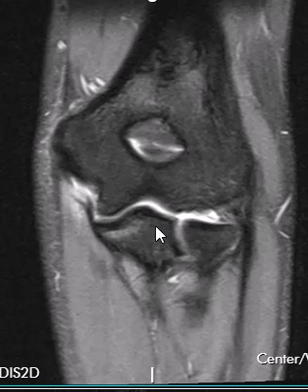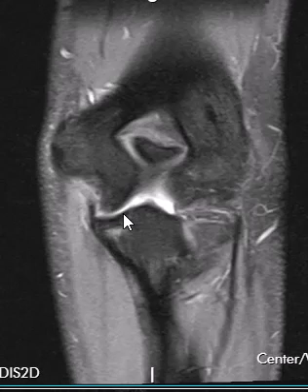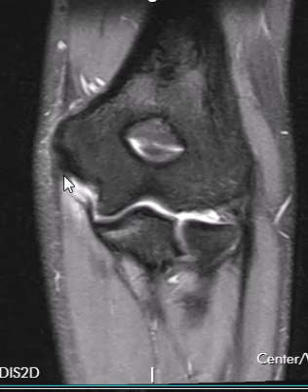So here we go. This is the medial side, and the ulnar collateral ligament has a posterior band that is back here. It comes off this horizontal part of the medial epicondyle, and it comes down here and attaches to this, which is the sublime tubercle.